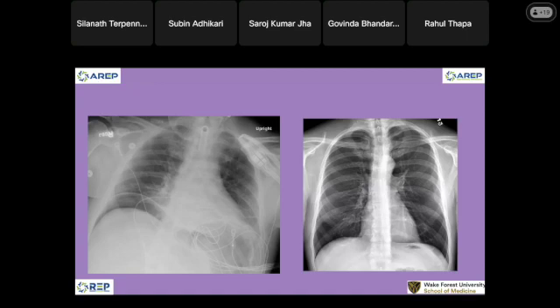But in the United States, you don't get an accurate clinical history. It's just bad. You have to dig it by your own and assume what you are looking for. Okay, this is a good, emergency one: air in the belly. I show you a little trace one. I did not have that sometimes.